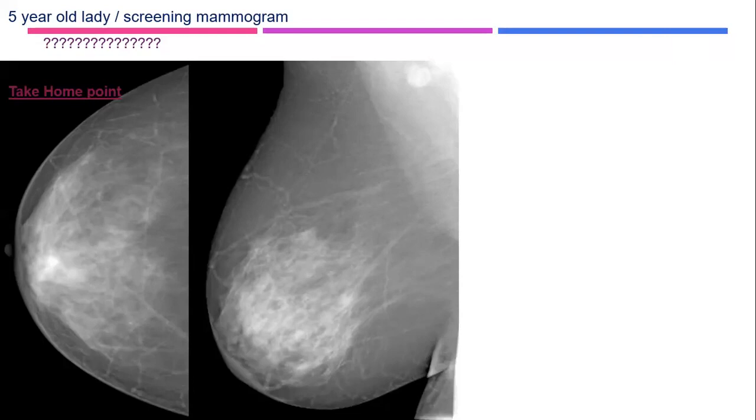But as you know, in screening, not all findings, especially single view findings, are significant. An asymmetry on a single view might be just superimposed tissue, especially as this skin thickening is seen on both sides. I suspect periductal mastitis or something, so I need a compression view.